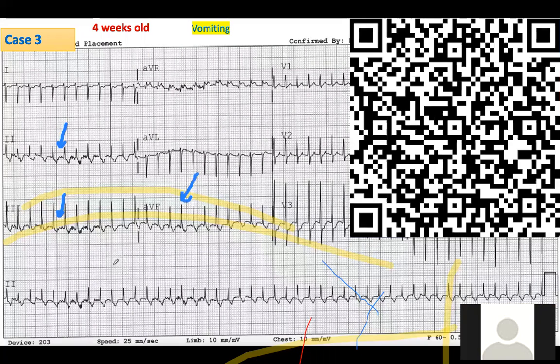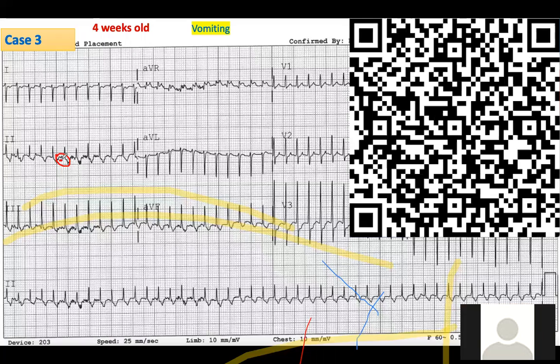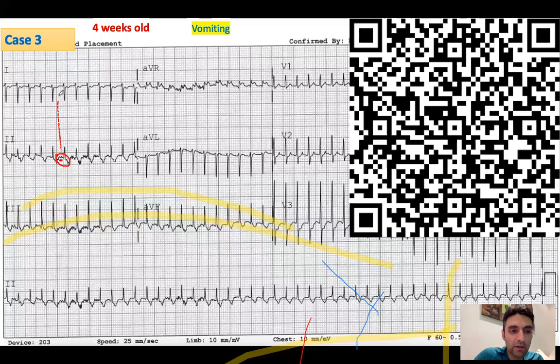Here. So you think this is a P wave, right? This is a positive deflection, right? Yes. Okay, good. You don't see it here. There's artifact. Okay, go up. Is there something here? No, I can't identify it in lead one.